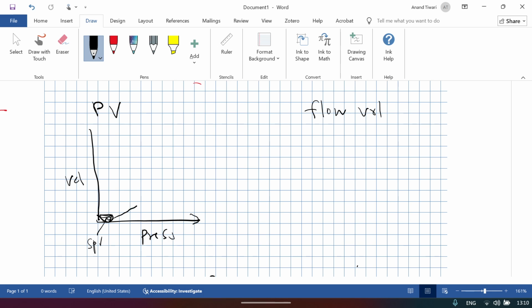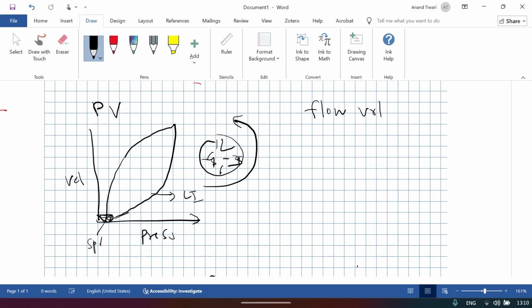So you see this inspiratory limb, and this is the maximum tidal pressure here. There is a lower inflection point, and then you see the expiratory limb, the upper inflection point, and coming to the baseline. If you see the clock, 3 o'clock, 9 o'clock, 12 and 6, this movement is going anti-clockwise. So the machine breath looks anti-clockwise, inspiratory limb, expiratory limb. And anything in a clockwise direction is a spontaneous attempt.